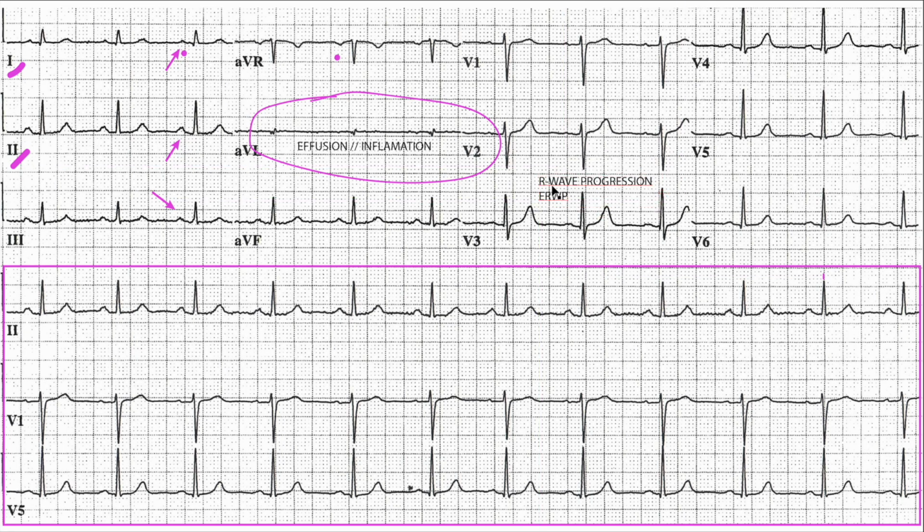So we have R wave progression that is early, or if you see this ERWP, that's all that means, is early R wave progression. When we add this lead AVL to it, there could be something going on here, and that's the reason why both of these things are showing up on the ECG.